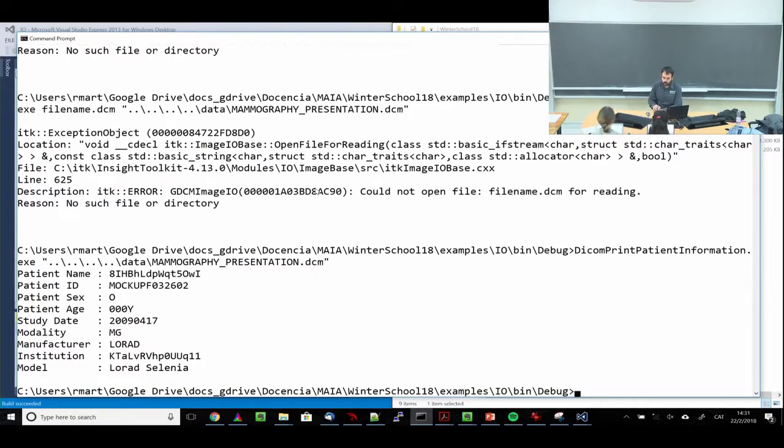Okay? So now this is executing what we tell it to execute in the program. I know there's a lot of things going on and lots of sources of possible errors. That's why I'll stop here talking and go around and check with everybody that could have a problem.